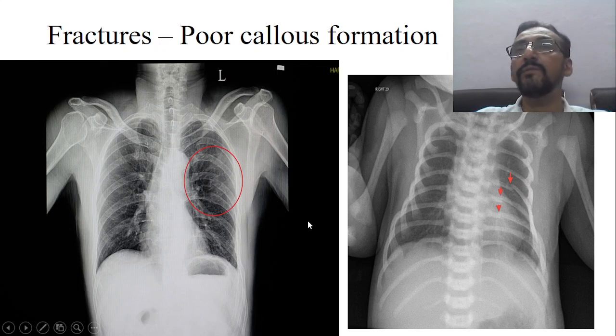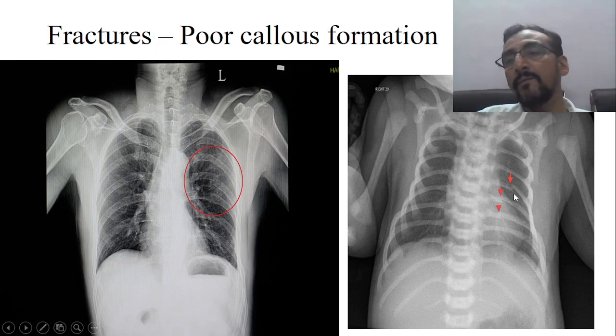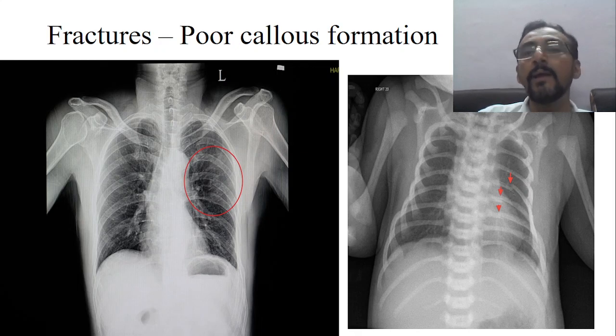Now you have to look into rib fractures also. Okay, so it's a clear cut rib fracture. This has to be seen. And in the second x-ray, if you see again these arrow marks very clearly showing the rib fracture. So these are some of the points that we can miss if we are not knowing this fact. ये fact देखना है बोल के, अगर हमें नहीं पता है तो most of the time ये जो है ये मिस हो सकता है.